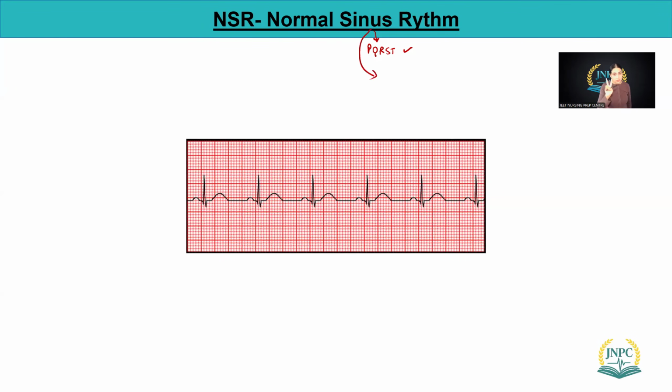And one more thing, two things you have to follow before you tell that this is sinus rhythm. Second thing is, ask yourself whether the impulse is regular or irregular. If it is regular, and if you see PQRST, this is sinus rhythm. I'm just saying sinus rhythm. I'm not saying it's normal, right? Because we have sinus bradycardia and sinus tachycardia. Those are where we see PQRST, but one rhythm is very low, one rhythm is really fast. That is normal, not normal, right? So normally, if it is meeting this criteria, we call it regular rhythm.